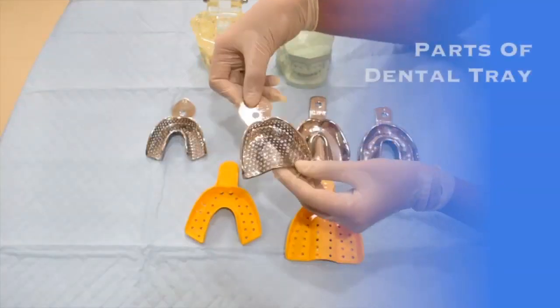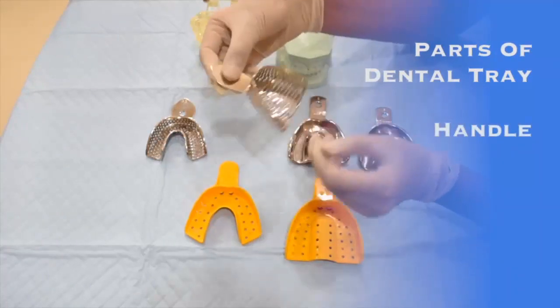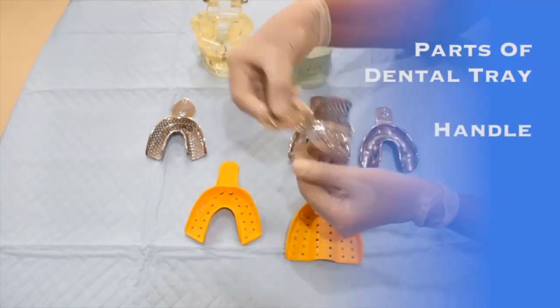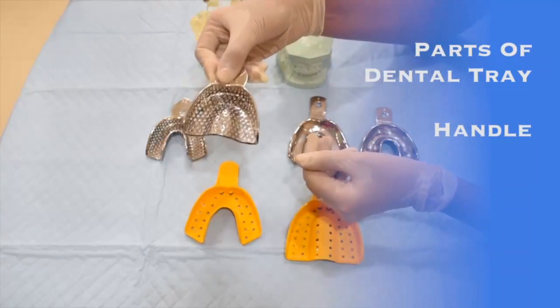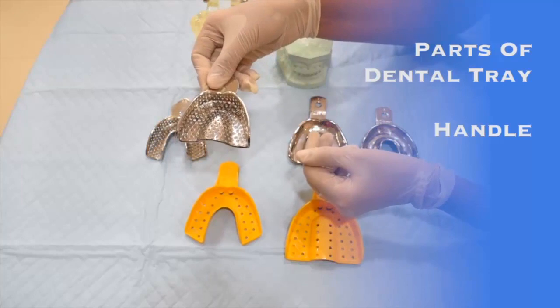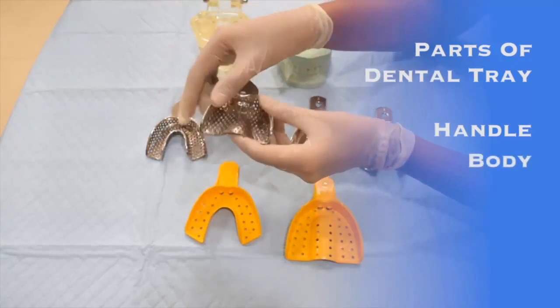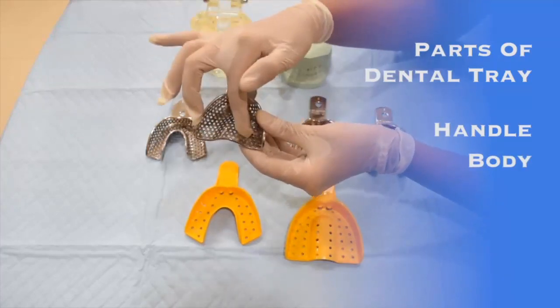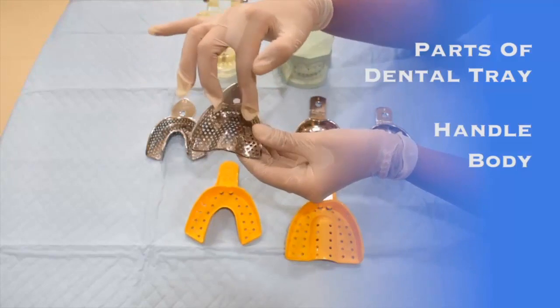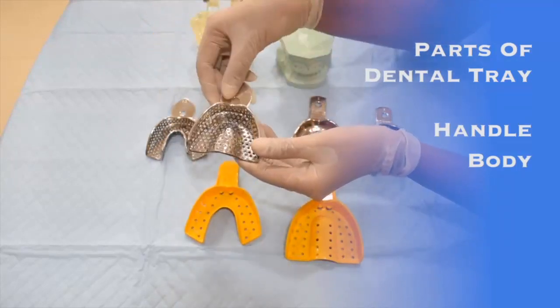So now let me tell you about the parts of an impression tray. An impression tray has got a handle. This is the handle of the impression tray. The handle is used to hold the tray in the patient's mouth while making the impression. Then there is the body of the impression tray. This is the body. The body has the floor area and the flange area. So this is the flange area and this is the body of the impression tray.